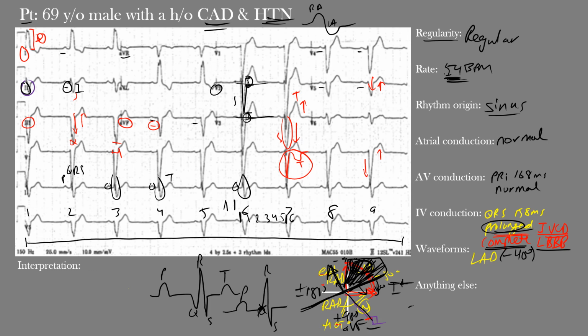Okay, now based on this criteria, we actually don't have left ventricular hypertrophy present. All right, but I want to go over it, because if this was present, because it's 100% specific, that means if the criteria is there, then we're dealing with some sort of hypertrophy, okay? So let's look at this criteria. It says that we take lead V2, and we're looking at the S wave in V2, and we're adding that to the R wave in V6, and if it is greater than 4.5 millivolts, then we would have left ventricular hypertrophy in the presence of left bundle branch block, okay?